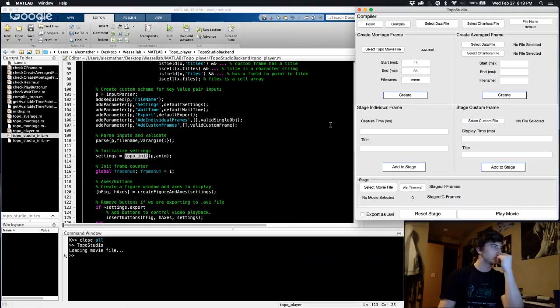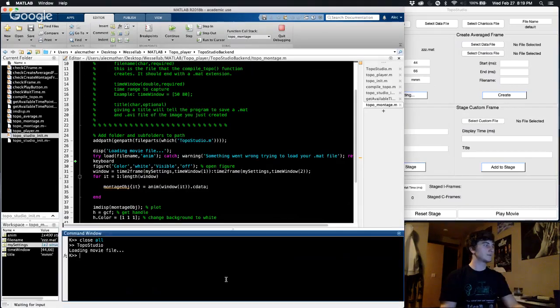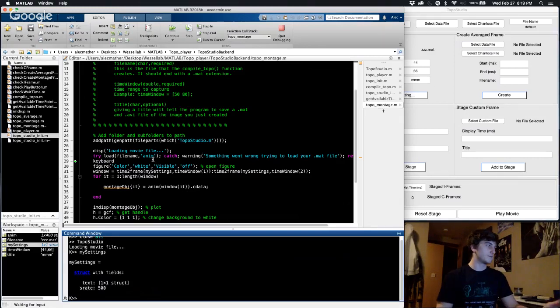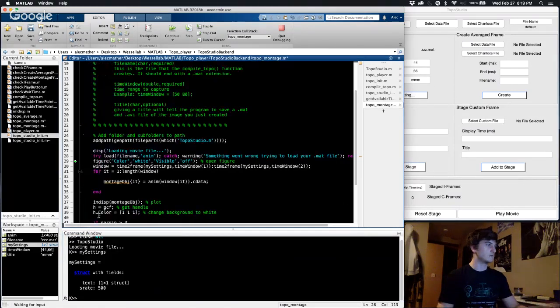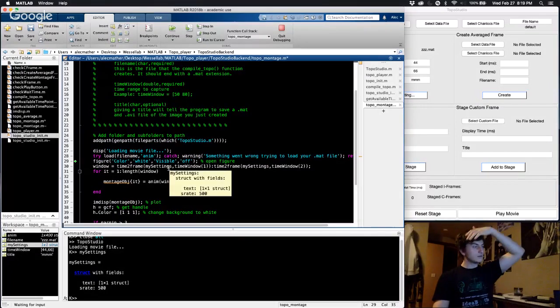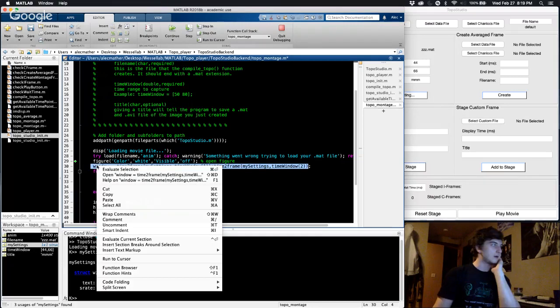It's so strange. Okay, well, it's getting it now, so I think it just wasn't saving or something. But we've got it now, and so now we can get our time window.